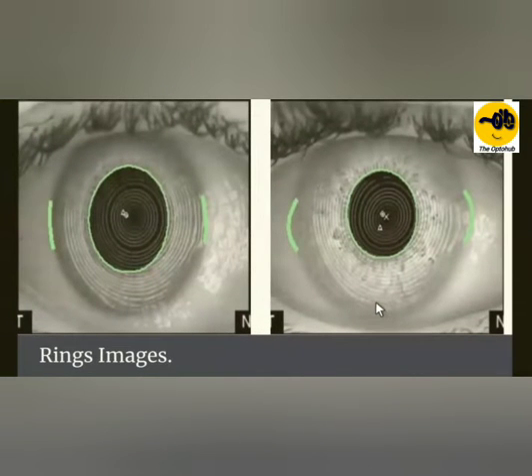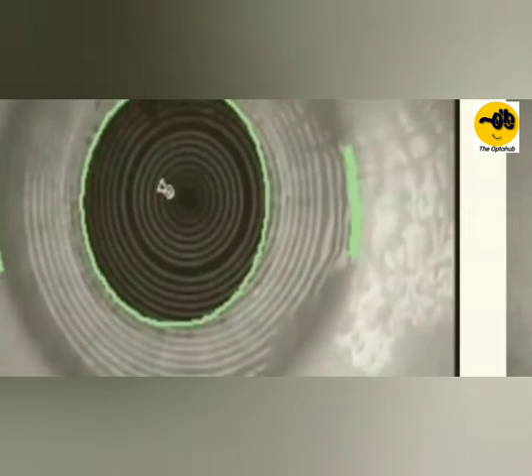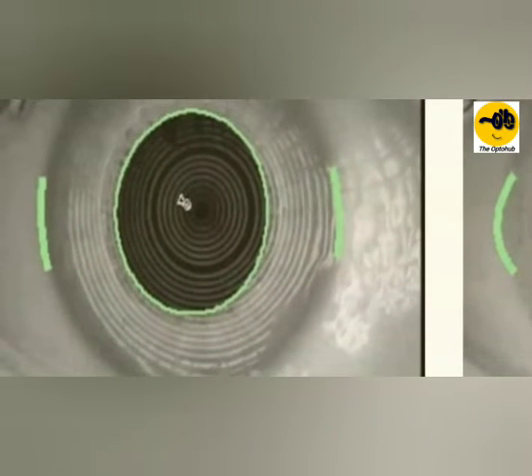So let's go ahead with that. The number one thing we need to observe before you look at any maps is the rings, the images of the rings. On the left of your screen, this is a very normal pattern that we observe of the rings, the reflection which is emitted from the cornea.